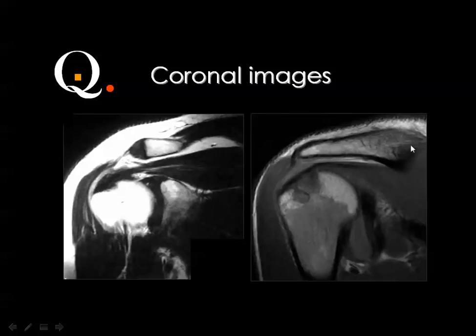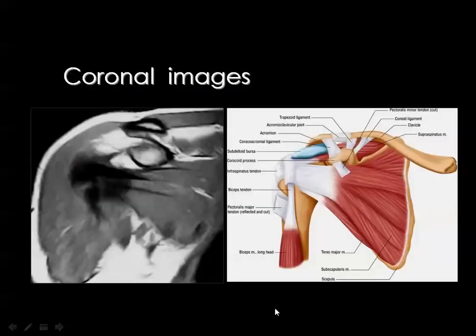This is the spine of the scapula with characteristic protrusion, and this is the infraspinatus tendon also inserting into the greater tuberosity. Then if you go anterior, you will meet the subscapularis, and this is the coracoid process, which is an anterior structure. This is the subscapularis muscle, which is a very big muscle, and it also has a very thick tendon which will insert into the lesser tuberosity.